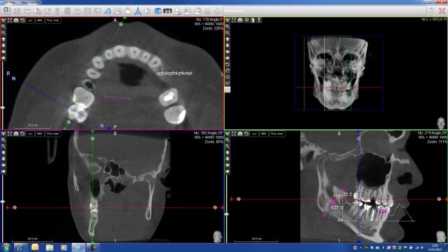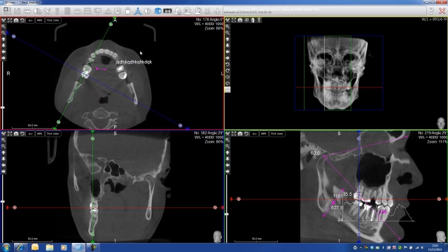Now, next one. The possibility to angulate, measure an angulation. Let's see, I'm an orthodontist and I want to measure a specific area. I come here, left click, another left click, another left click here, and I've got my degrees, my angulation. Of course I can do it wherever I want. I do it again, I come on this option, here, here, here, and it gives me the degrees of the angulation.